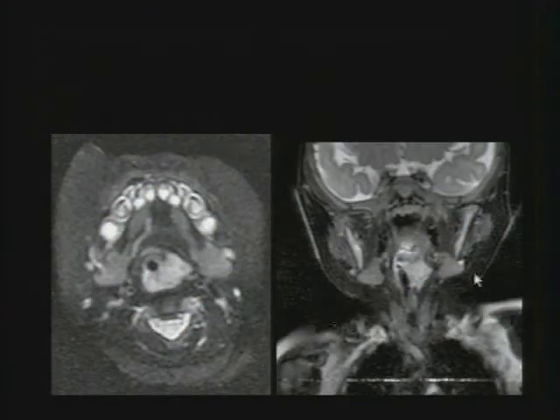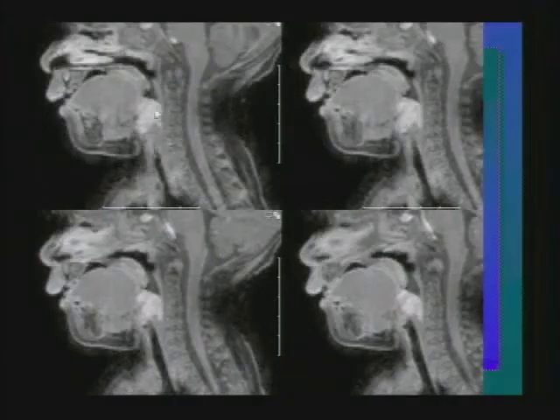Remember, unknown 1. Here on the CT scan, you can see the thyroid gland, the carotid artery, the jugular vein, and the enhancement of this subglottic hemangioma and the tracheal narrowing, which is impressing on the right side. This is a color rendition. Sometimes we do a CT because it's quick and we don't want to sedate a child who is having airway problems. This child required intubation. You can see part of the tube, and an MRI without radiation would also show the hemangioma very well, in the subglottic region. Here you can see how the lesion would cause some airway symptoms.